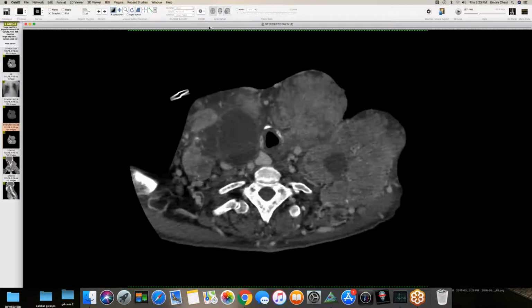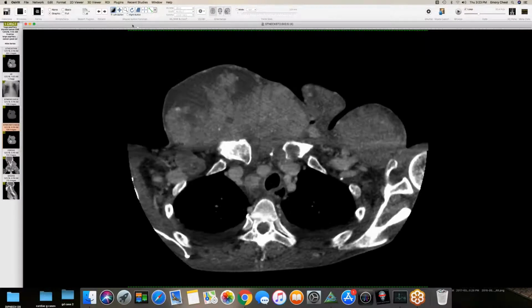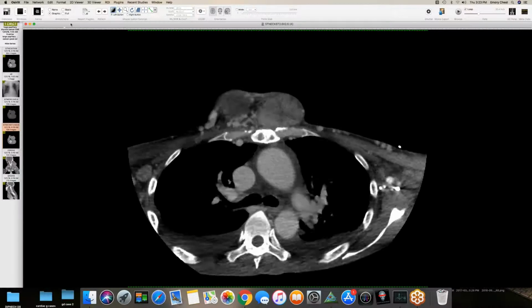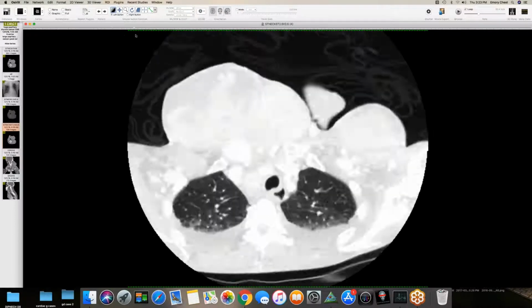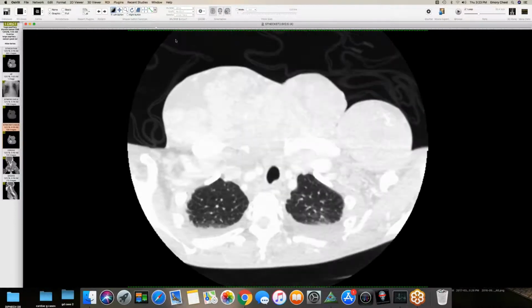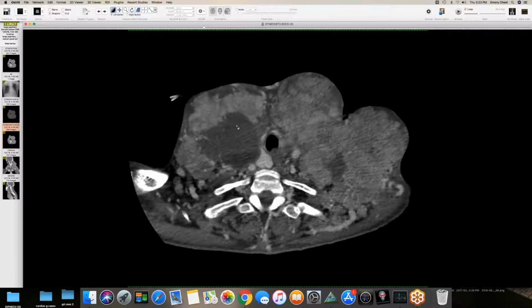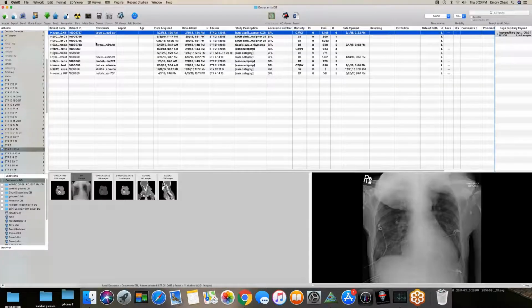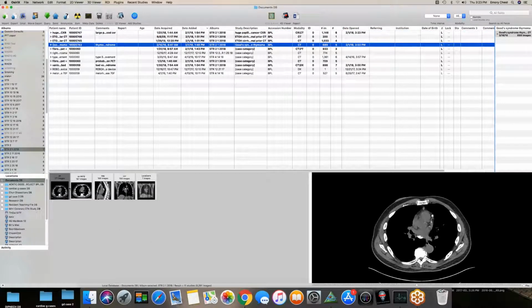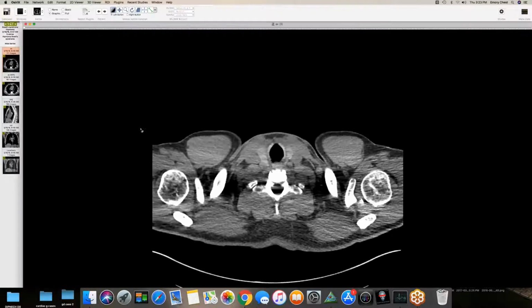But have you all seen a case that's dramatic of that entity? Presumably, I believe these nodules were, I don't have the full chest CT on anonymized here, but presumably some metastatic nodules that we're seeing on the radiograph. So I just thought that was a nice accompaniment to Travis's case there. We've never had this many interesting thyroid cases in one day.